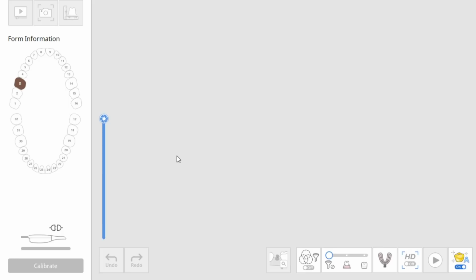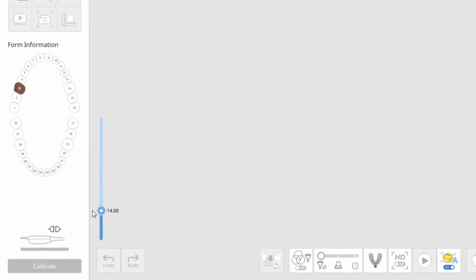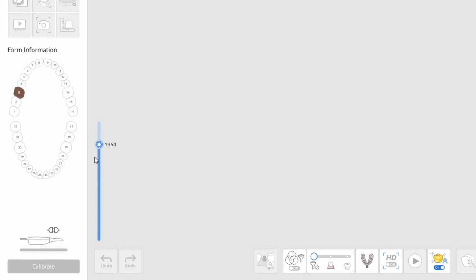With intraoral scanning, it's very simple. You can scan a full arch in seconds if you control everything that intraoral scanners don't like, which is namely moving parts, dark areas, the oropharynx, liquids, blood, saliva, all those things. You manage that, you can turn this to full throttle and have the camera pick up as much information as possible. But if you're inexperienced and new, you may inadvertently pick up the tongue and the lip, which slows you down dramatically as a user. It gets frustrating. So this tool is very powerful, and you can automatically adjust it to multiple settings.